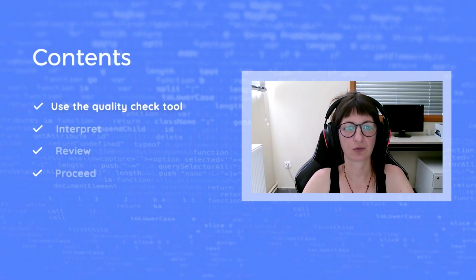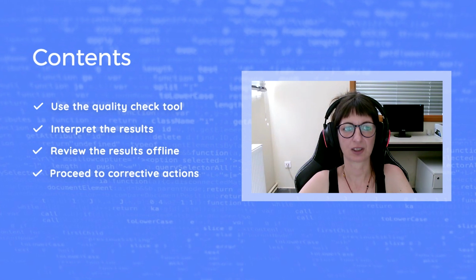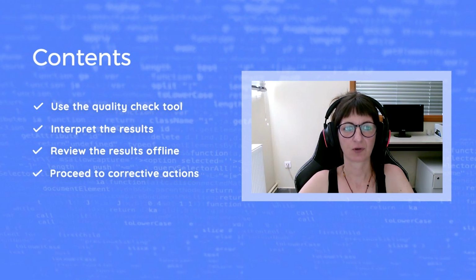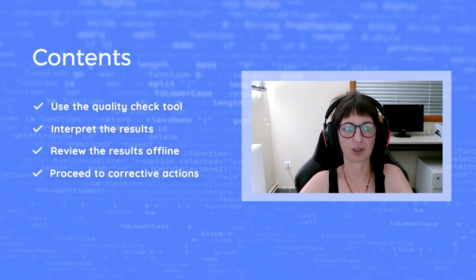In this video, you will learn how to use the quality check tool, interpret the results, review them offline, and how you can proceed to corrective actions to conform with the project's requirements. If you need more information and to discover what sets the quality check tool apart, you can read the scientific publications that describe the tool in more detail.